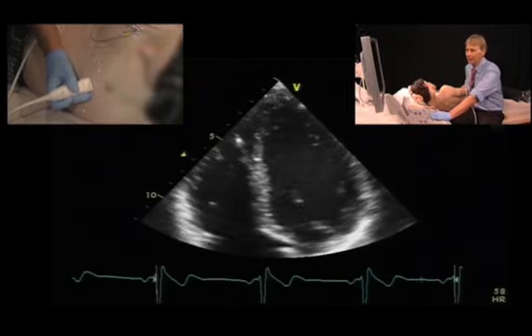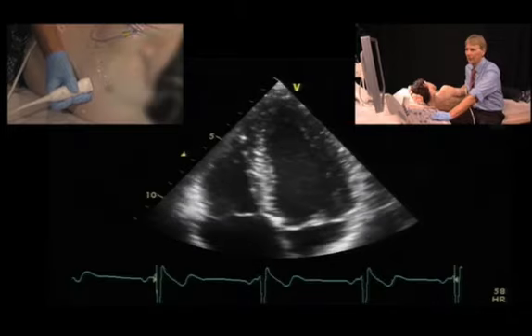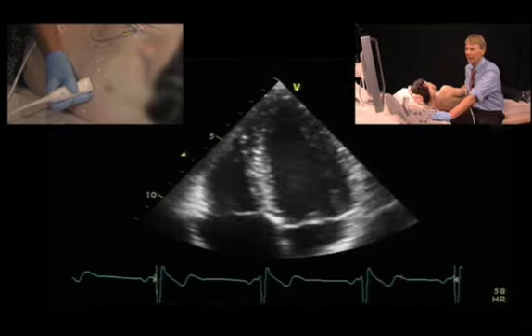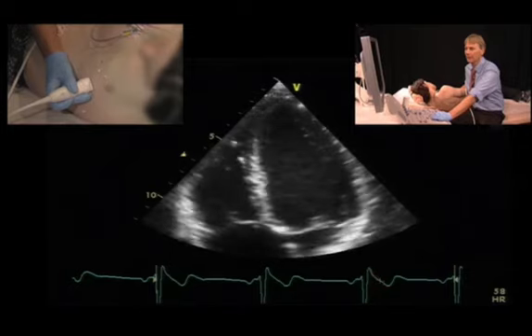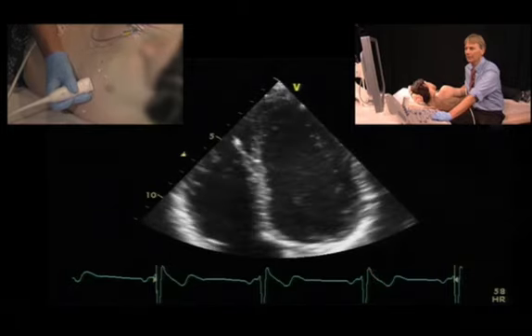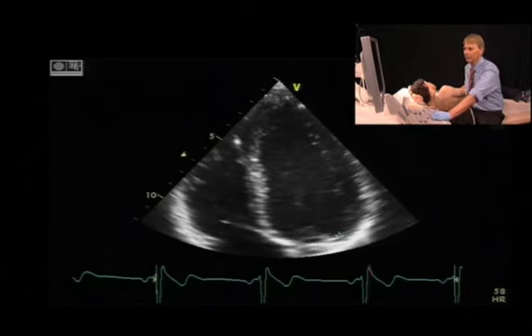Now sometimes we have difficulty to really determine where the endocardium is. It's usually easier if you move the trackball and the frames back and forth, because you can appreciate the contours better in a picture that is moving. And if you remember where the contour is, you will find it easier to track the contour then. So I will go to the measurement program and then I will trace the contour.